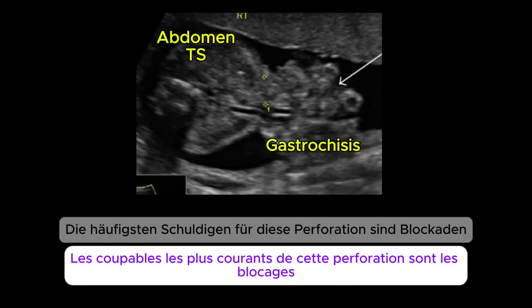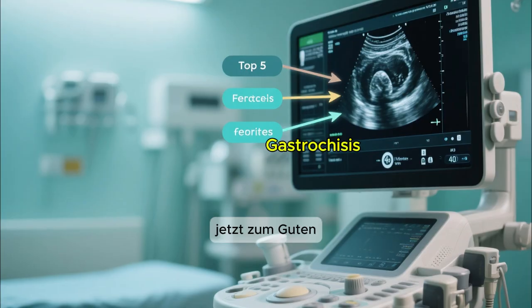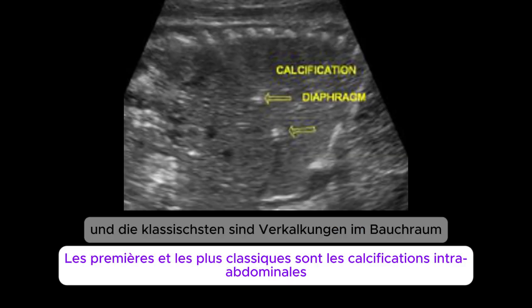The most common culprits for this perforation are blockages like intestinal atresia, a twisted bowel known as a volvulus, or sometimes conditions like gastroschisis. Now for the good stuff. What are the top 5 ultrasound features you need to spot? First and most classic are intra-abdominal calcifications.